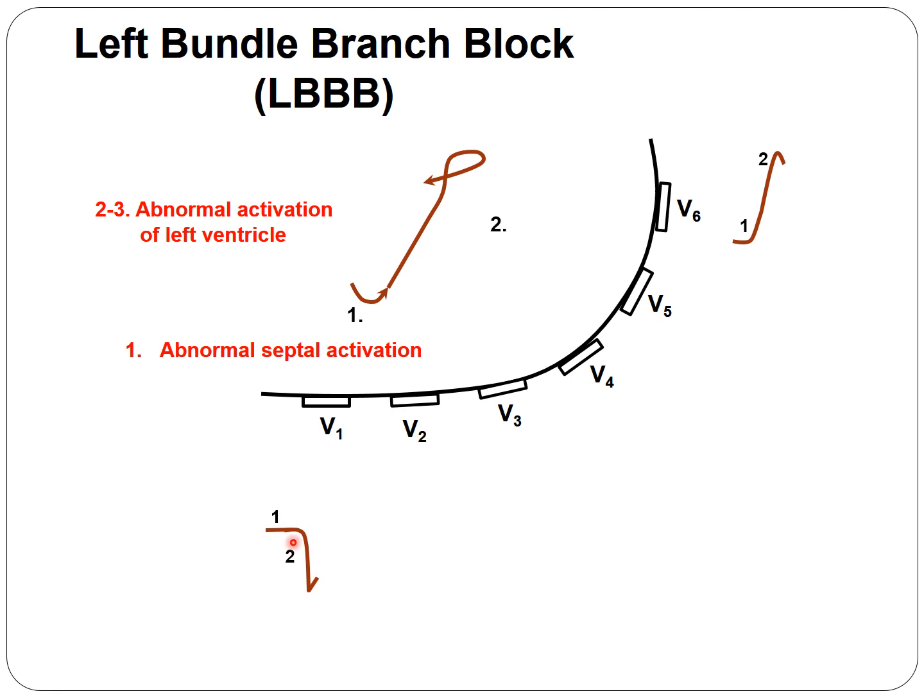And this is why we have a deepening of the S wave, a little increased by this loop, but we have the end that can cause a notching of the QRS complex, in the S wave in V1 and the R wave in V6. And when it's finished, everything goes back to the isoelectric line.